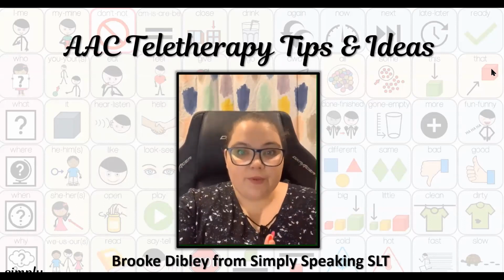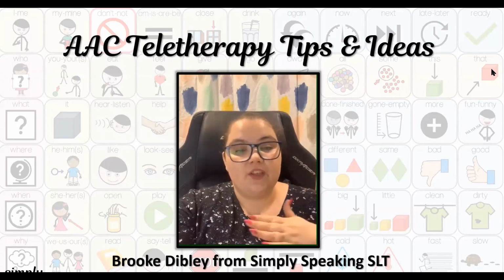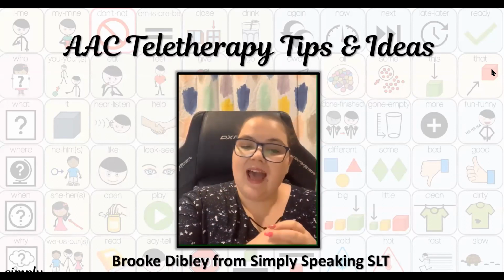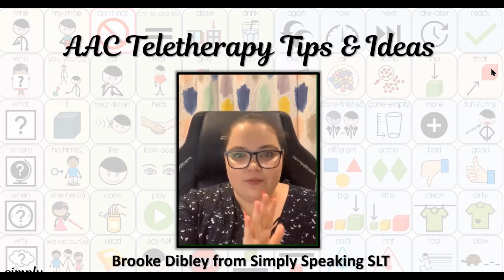But today I'm going to be talking about modeling AAC, and in this video I'm going to be sharing my screen. And so the idea would be that you share your screen during Zoom. On my screen recording software, you're going to see a little red circle around my mouse. Unfortunately, that is only a feature of my recording software. I have not worked out how to ever get that to work on Zoom, but I just wanted to highlight that.